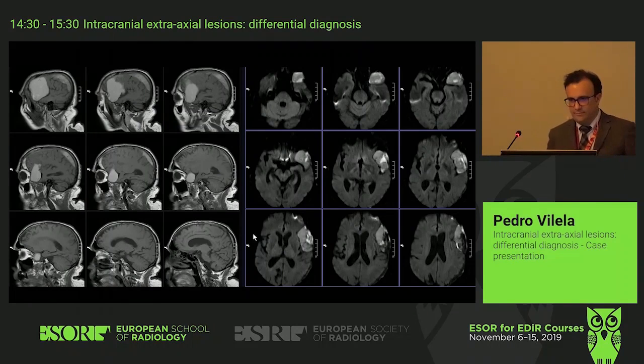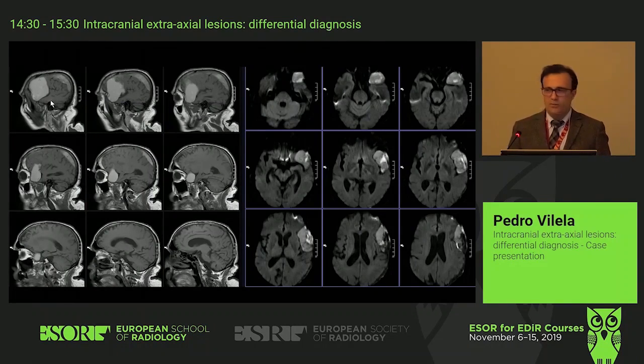Well, nobody said that this could be fat. Can this be fat? It's hyperintense on T1. No, it was not fat. It could have been a dermoid cyst, right? It's not fat. Leptomeningeal cyst, neuroenteric cyst, very lateral. Growing, but the cyst has no CSF signal intensity. Epidermoid.